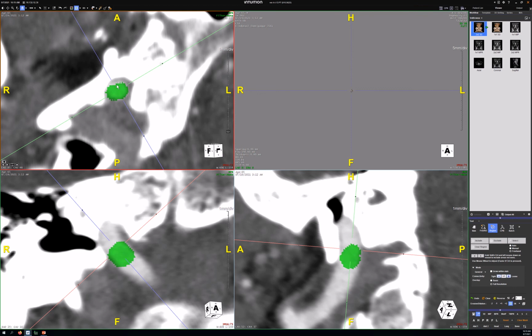And just remember, even though it looks like they're good on this one already, like maybe you picked up all the voxels in this plane, we're doing our spheres in multiple planes. So click there, and then move it too far, obviously. Okay, right there. So this looks just about perfect. Now see there's a little gap right there between the blue and the green. First of all, hit Include, and then we'll analyze it.